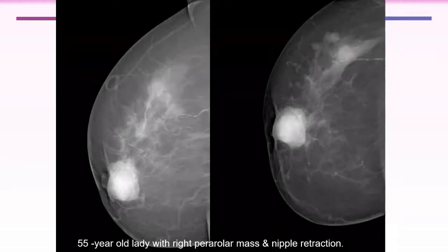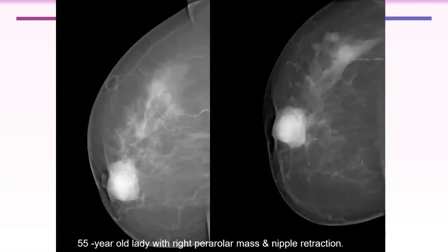But the rest of the skin is unremarkable. Focal nipple areolar complex thickening and retraction. What else? No abnormal calcification. No obvious calcification. Okay. What else? Any other abnormality or only this one?